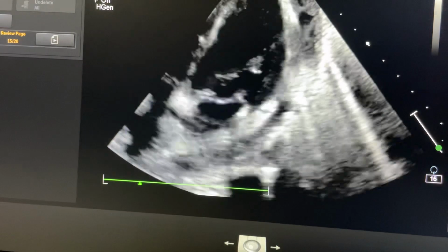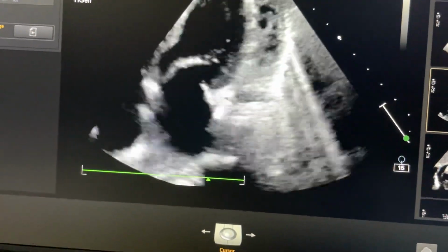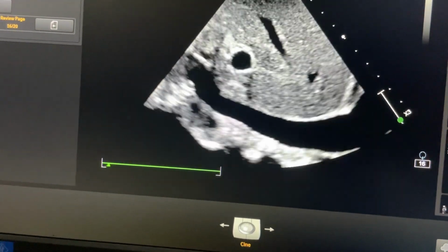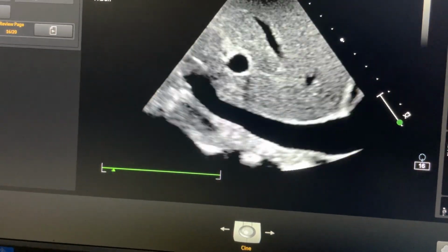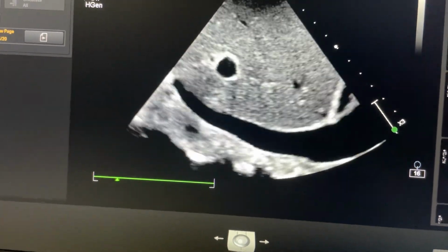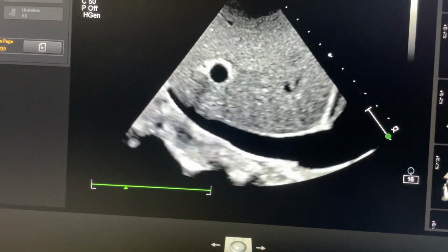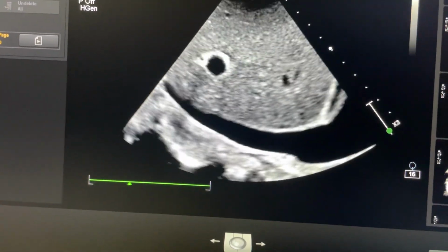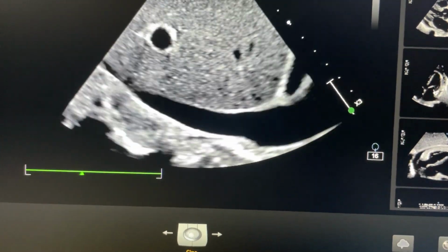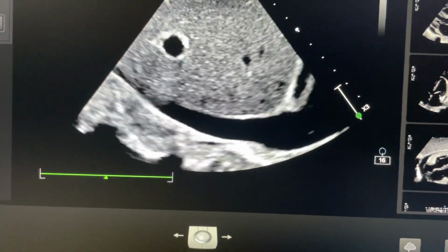Second thing, for constrictive pericarditis, the size of IVC has to be dilated and not changing much with different phases of respiration. That is, inspiratory collapse is not seen, almost dilated. Less than 50% is significant. So if size is more and does not change with inspiration, that means the pressure inside IVC is quite raised.